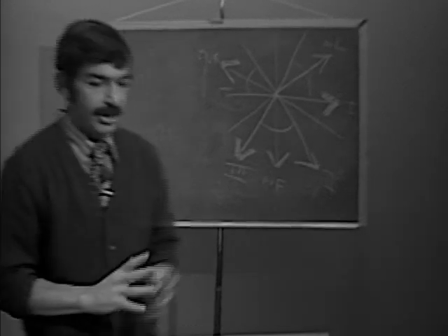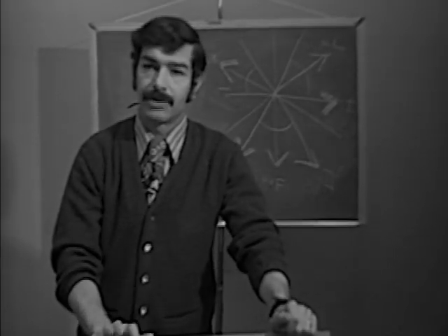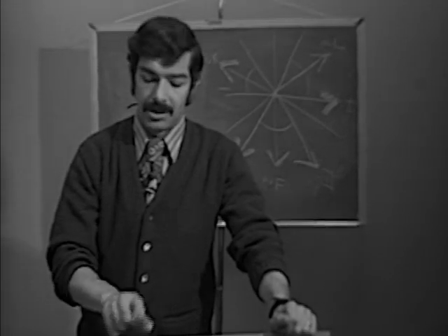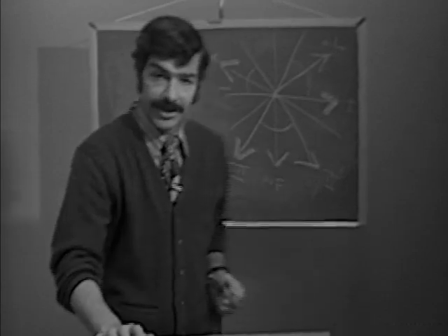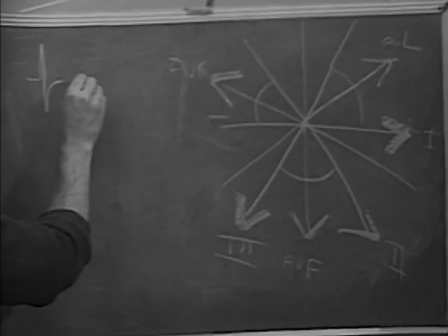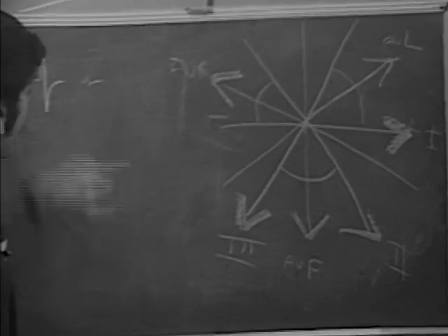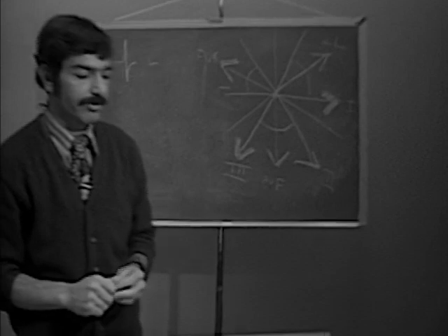What you do is you take a look at the electrocardiogram. You just look at the frontal plane leads: 1, 2, 3, AVR, AVL, and AVF. And you look for the lead which is isoelectric. By isoelectric, we mean equally up and down; the point is that it has to be the same area above as below. That's the isoelectric lead.